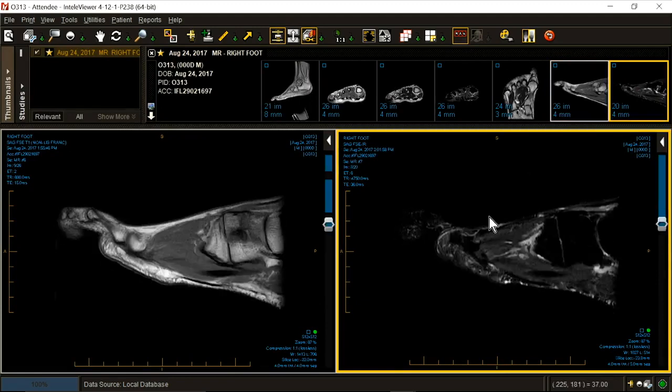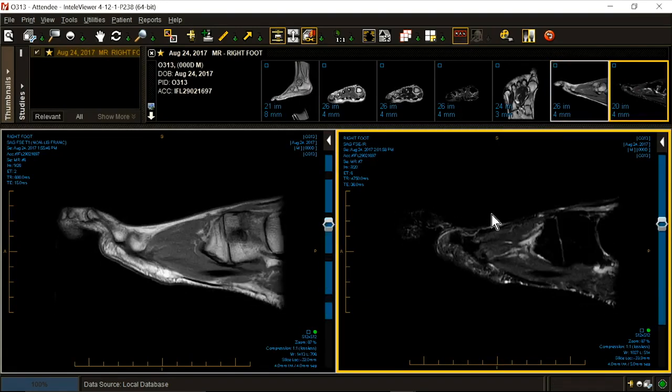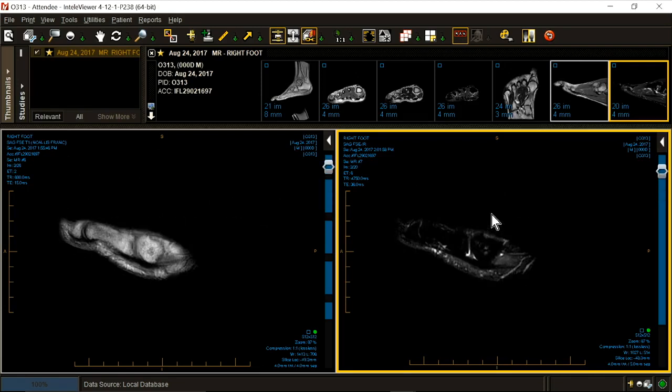Let's go sagittal. Stay with the same theme. Achilles tendonitis. The patient has difficulty pressing on her heel and now has developed, due to altered mechanics of weight bearing, pain in the heel and the foot. Rule out plantar fasciitis.